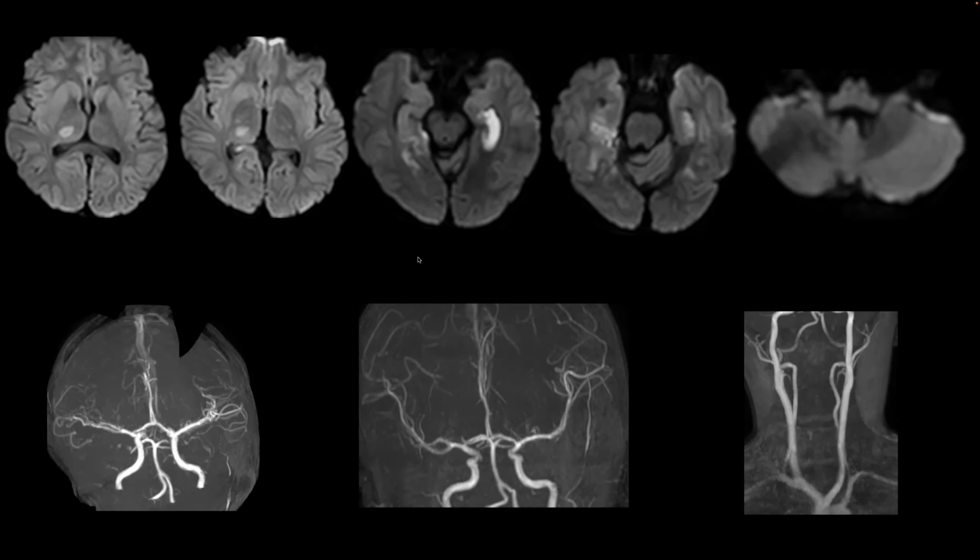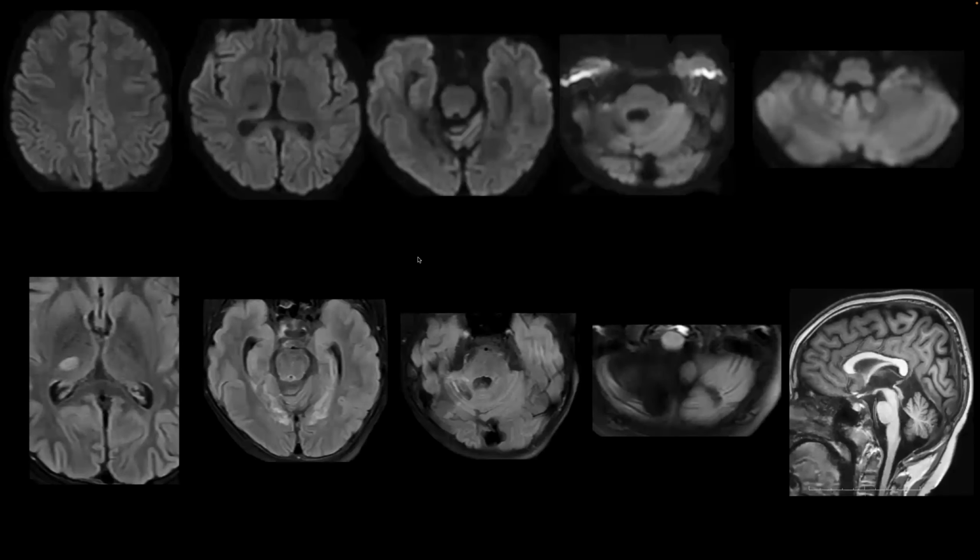No, vessel wall enhancement can persist, Dr. Kavita. Just before, I had another question, Nihal. Does vessel wall enhancement always mean vasculitis? Because Mahendra from Sick Children tells me that it's seen in many conditions and doesn't seem to be very specific for vasculitis. Or for some inflammation, that's what I meant.